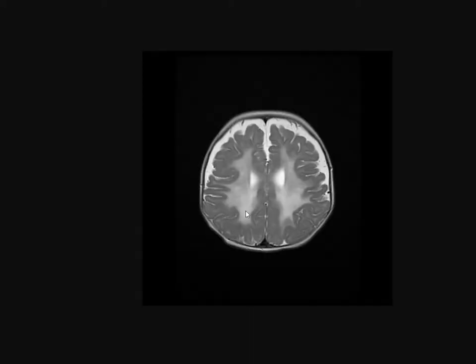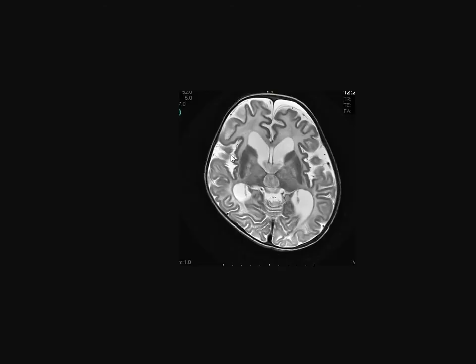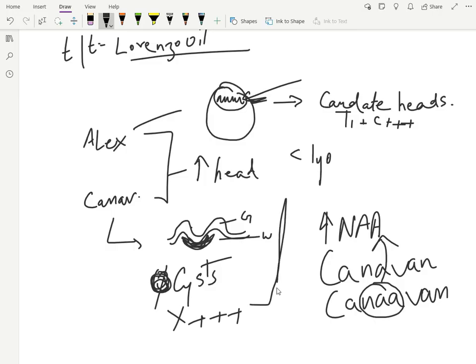Now, in comparison to metachromatic leukodystrophy, this was deep white matter involvement. The subcortical white matter was not involved, like you can see over here. There are no hyperintensities in the U fibers. But over here in Canavan, it's completely different from MLD. You have the U fiber involvement, so that's how you can differentiate it. And let's say MRS, if you do the spectroscopy analysis, you will see a very big NAA peak. So that's a dead giveaway.